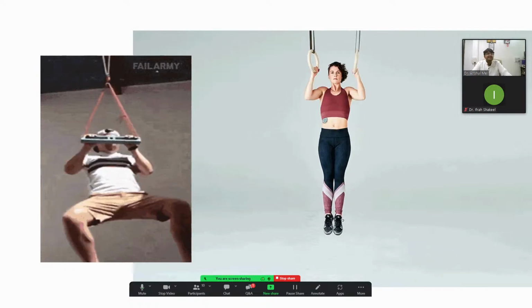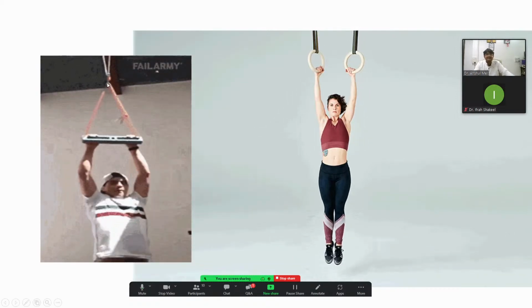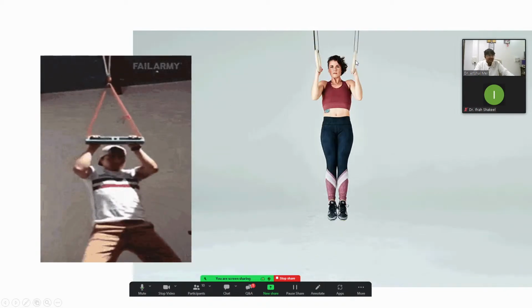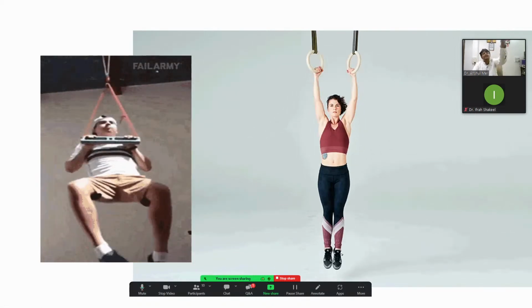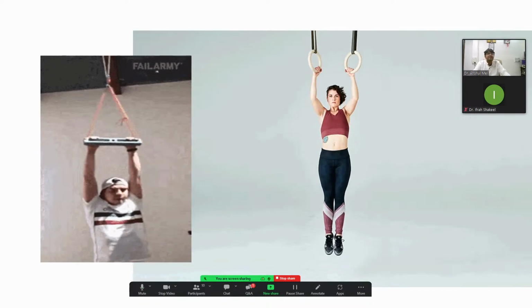So what is the difference between the OT Equator and the normal multi-unit? On the left side you can see there is no stress breaking, and on the right side there is a stress breaker in between. So when it is transferring the forces, it will not transfer exactly to the end of the product, onto the implant. So it has a stress breaker in between.